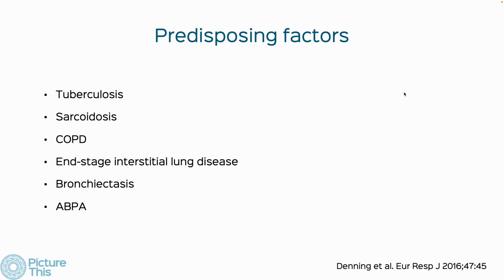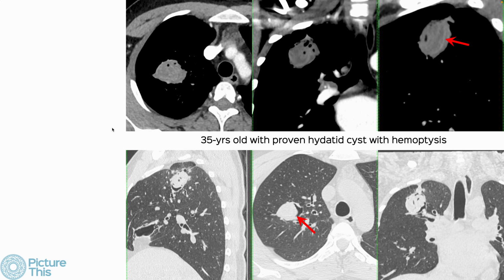It could be ILD, and we've seen fungal balls within the honeycomb cysts of ILD, and maybe I'll show that another time. In large bullae, bronchiectasis I showed you. In ABPA, you can have secondary fungal ball because you've got bronchiectasis there. And then in PTLD and similarly in sarcoidosis, if there's been a lot of fibrosis and cystic or cavitary change.